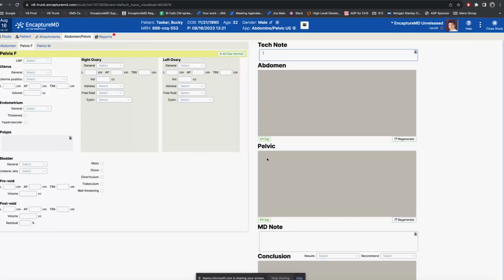So they can go back in and edit it at this point, or they can just free text something here, or like I said, dictate or use a template. So the beauty of this is that in an all dictated summary, you don't oftentimes get the numbers unless the doctor has dictated the various values into the report. Dictating values has some chance that you're going to dictate the wrong number, or it's going to be misinterpreted. It's not going to be formatted into tables.